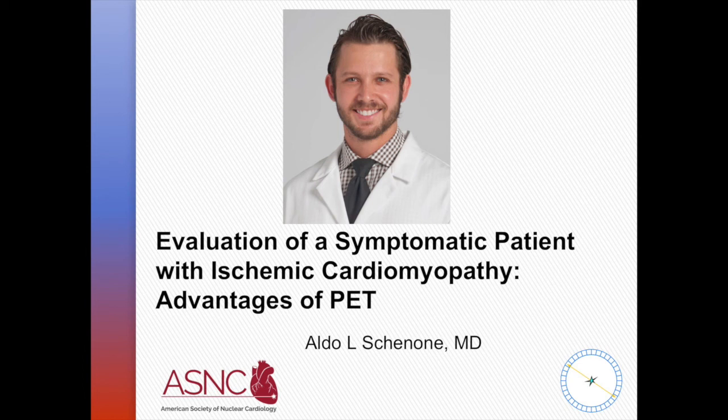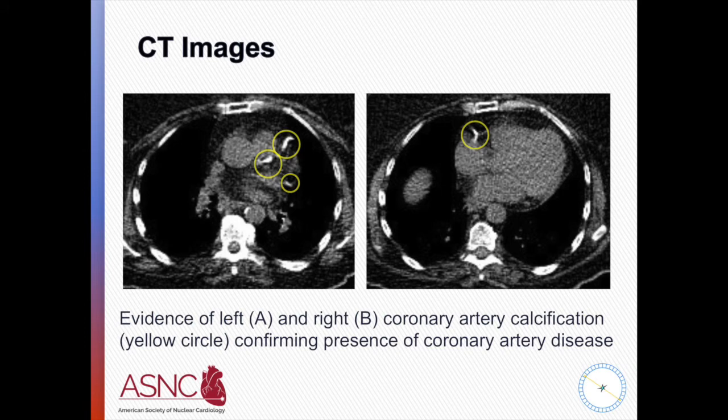So I think you need to maximize the information that you can gather with PET, and the PET provides you with CT images that you can actually go and review, as we did in this case, where we identified the presence of coronary calcification, which supports the diagnosis of coronary artery disease, and again adds more evidence towards the theory that this is probably ischemia in that segment with ischemic memory explaining the FDG uptake.